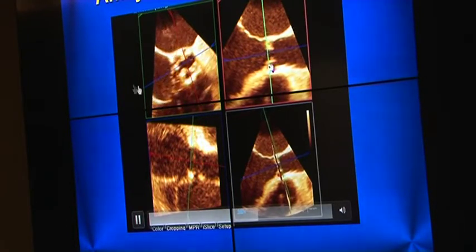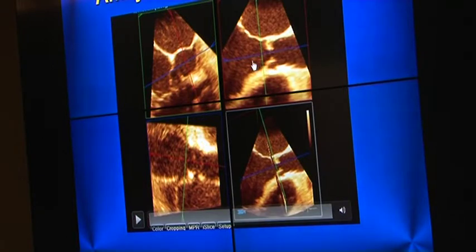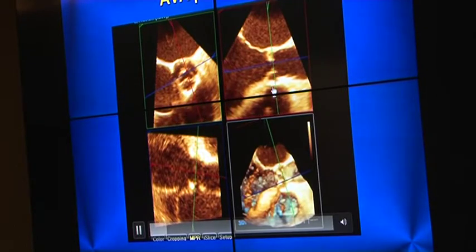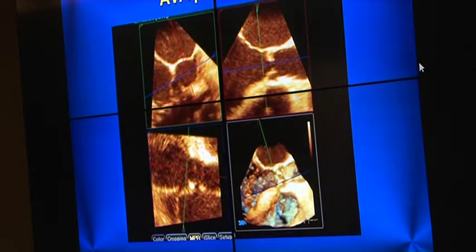We align properly anatomically, and then just with a perpendicular plane, we define at which level we would like to measure something. For example, if we stop at the tip of the cusps, we can perform 3D guided planimetry, which is more accurate than 2D measurement.